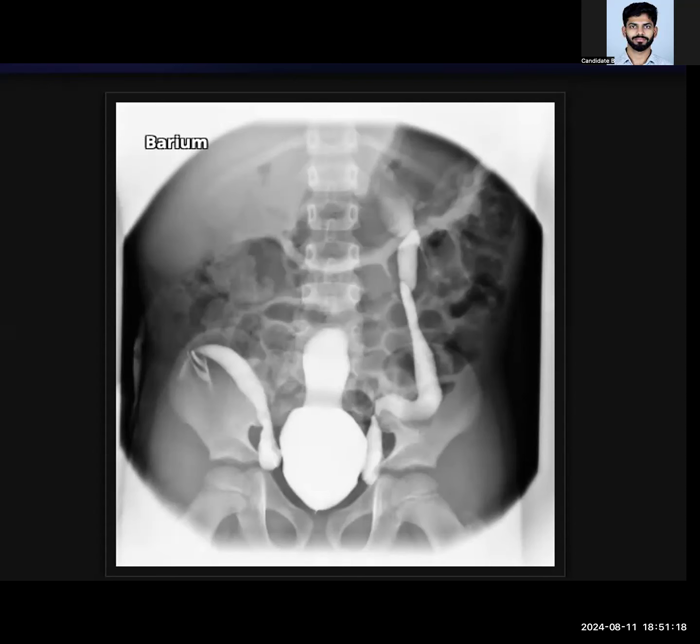I can also see increased density along the wall of the adjacent bowel loop, possibly along the transverse colon. Not sure whether it is a contrast leak or not. I would check all the images and compare with the non-contrast images to assess better.